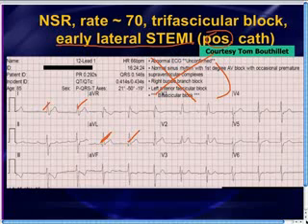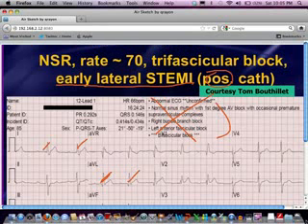All right, so hopefully, once again, just hammering home that 5-step method to interpretation of 12-lead EKGs. And every time you come up with an abnormality along your journey through those 5 steps, you stop and think about the differentials. We'll continue doing more EKG differentials like this. And if you keep practicing this, those EKG differentials will, like I said last week, become just like the back of your hand. You will know them inside and out, and you're going to pick up a lot of diagnoses that the machines and a lot of other folks may miss. Simple, simple, simple.